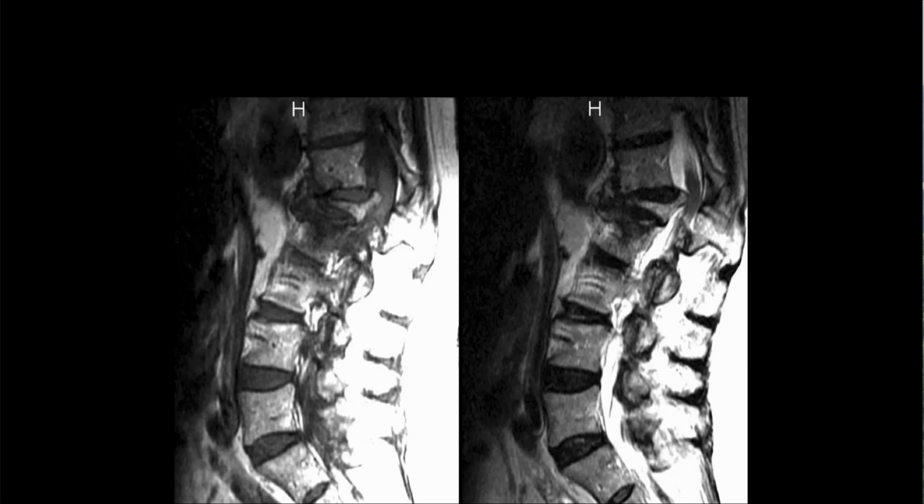Okay, who's next? I believe it's me. Okay, go for it. All right, so here it looks like there's another compression fracture, pretty extensive height loss. I think that's L1. There's a fracture of the L2 superior end plate as well, not as extensive a degree of height loss there. There's some focal kyphosis and then pretty severe spinal stenosis.